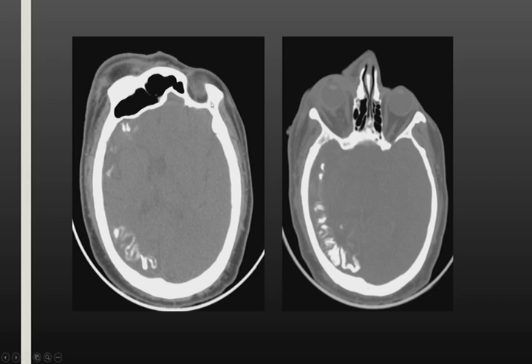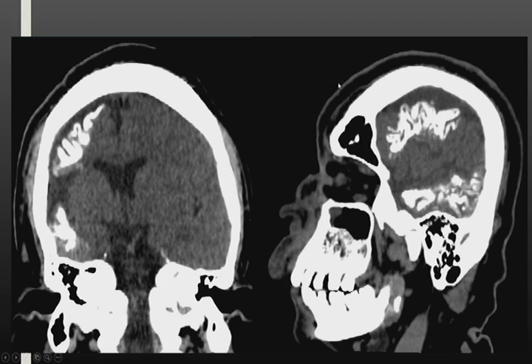There is an increase of the volume and density of the soft tissues. The same findings are seen in the coronal and sagittal reconstructions.